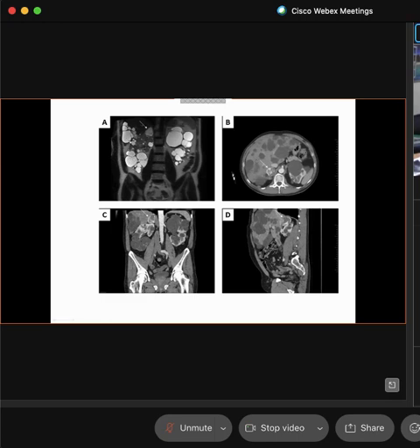A lot of you are saying the liver, and we know that the liver occupies the right side. If you forgot, this is a great opportunity for you to go back and refresh your memory. Okay, so this is the liver. It looks somewhat different, right? It could be gases, but it could also be pathology to mimic, not gases, but depending on where it was cut, it looks not so solid.